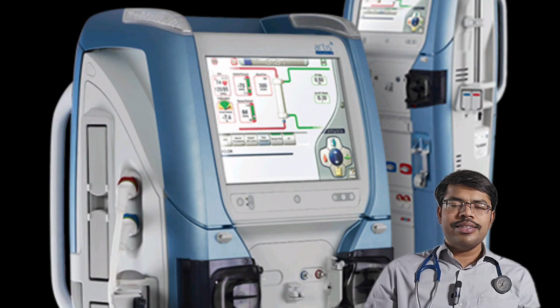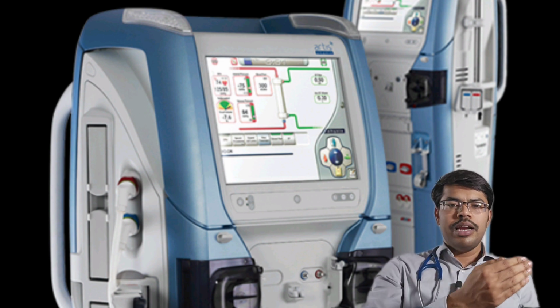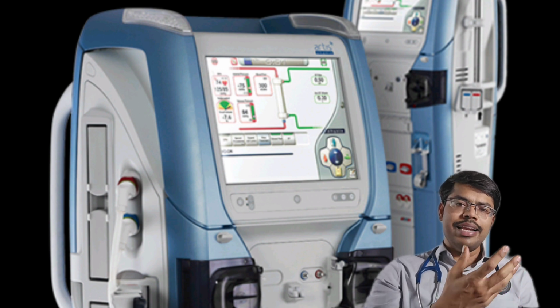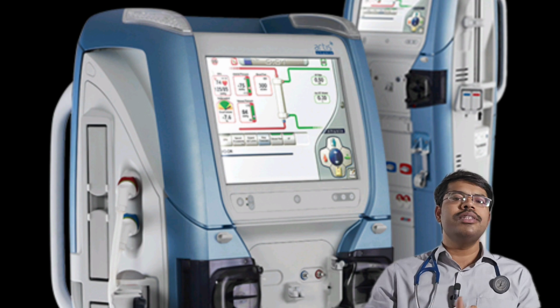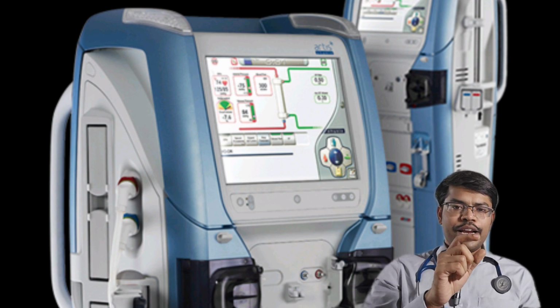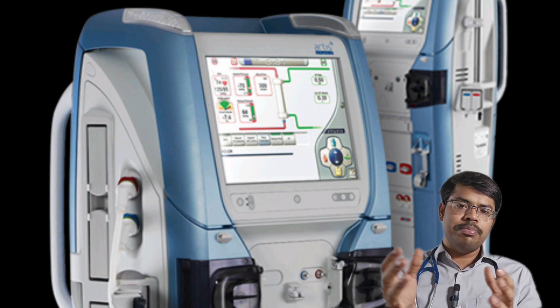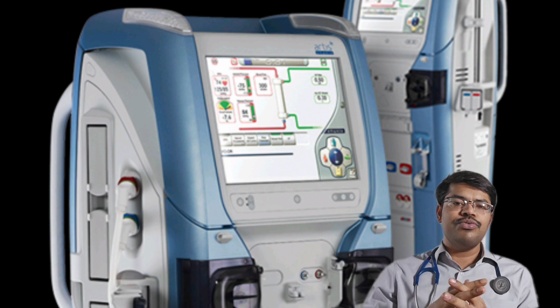To keep the understanding simple, we can see the overall hemodialysis machine under three categories. First is the extracorporeal circuit, which contains the blood pump, the operating panel, the air detector, heparin pump, the dialyzer holder, all those parts which handle the blood tubings and the dialyzer. The second one is the hydraulic circuit, which makes the dialysate. For example, part A, part B, the RO water, all three come together and finally the dialysate is formed.